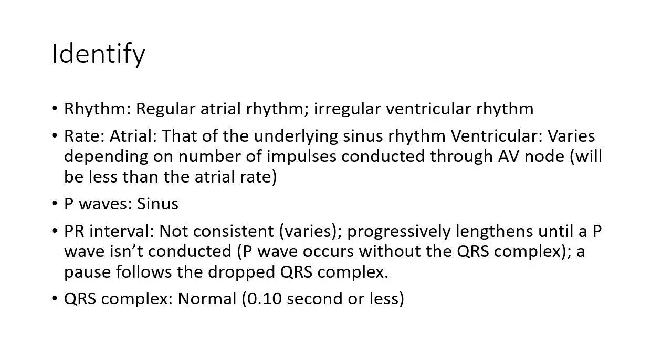Okay, so now again, make sure you understand the explanation of not conducted. You've got a P wave, but then you don't have a QRS. Okay, and then you've got a pause that follows the dropped QRS. Do you see that in first degree block?